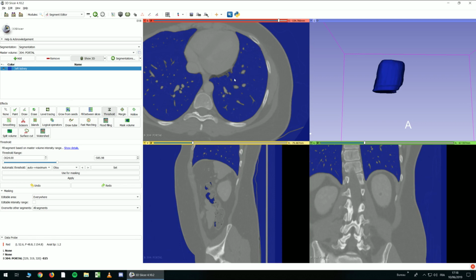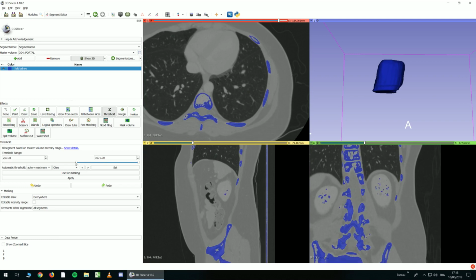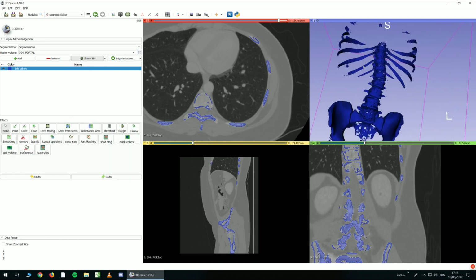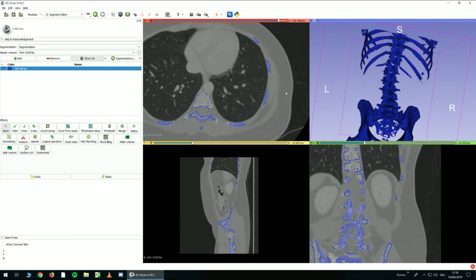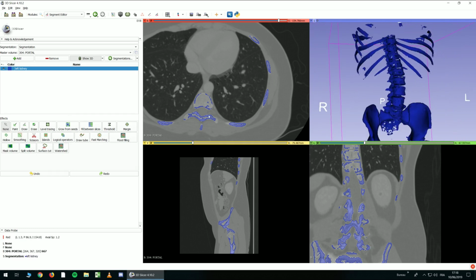which is highlighted. So for example, I can show you what it makes with the bones. Okay, so if I click apply, it will take a lot of time because Show 3D is enabled. I have a good computer, so it doesn't take a lot of time, but it can on another computer. Okay, and if you click apply, it gives you this.